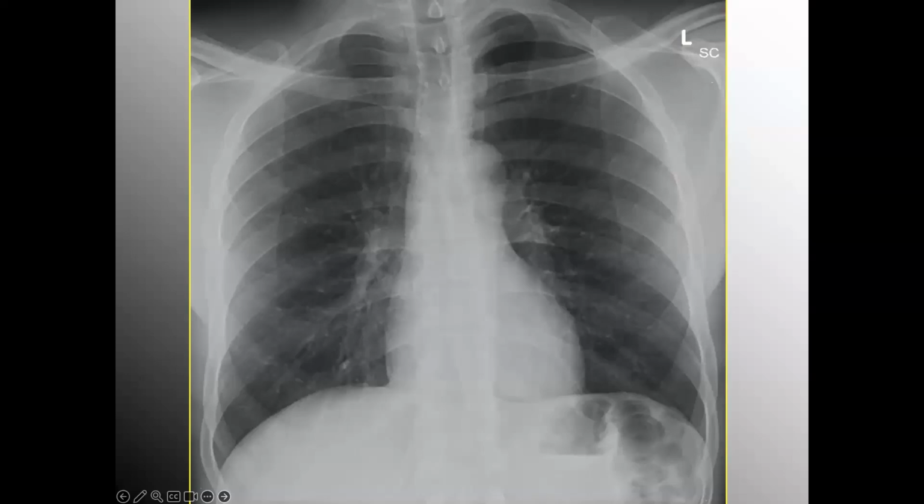Before we go much farther, let's do a quick overview of X-rays in general and just brush over some key terminology and concepts, some dealing with quality and others just defining the various descriptors. When you talk about an AP X-ray, we're saying it's shot from anterior to posterior, from front to back. Most of your patients that are bed-bound, non-ambulatory, have a film slid under their back, or they might be prone, and then it's a different situation, but we're shooting the X-ray from front to back, that's AP.